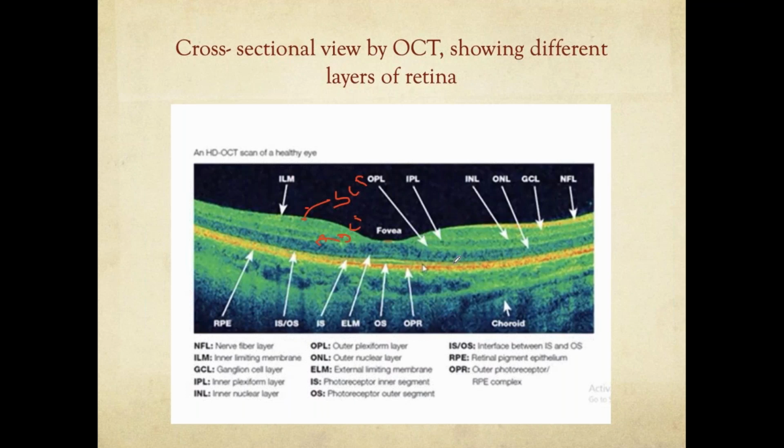Although this part of the retina is fine, and the RPE and the ganglion cell might be completely fine, the nerve fiber layer and the ganglion complex, since the signal is not reaching the other side, there is a signal drop. Whatever message the outer retina is trying to send to the inner retina, the message is being dropped. So this signal cannot be transferred.